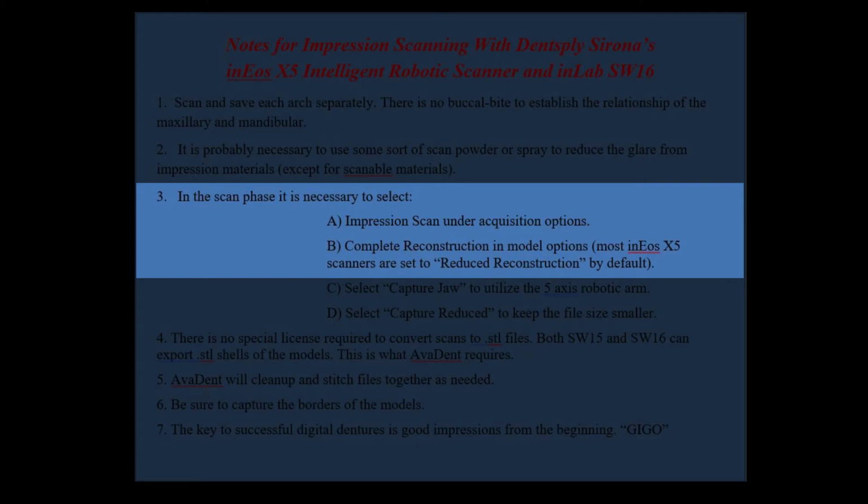If you should go forward and did not select it, you can always go back to the scan stage, unlock the images, click on the catalog, then change it to complete reconstruction, then arrow forward. It will recalculate with the data you need.